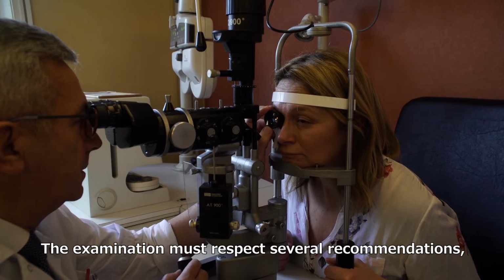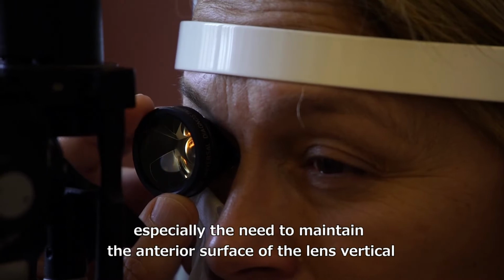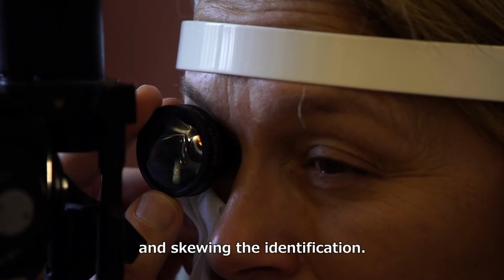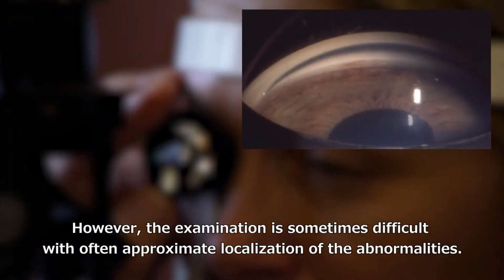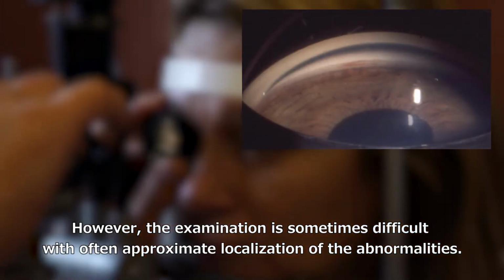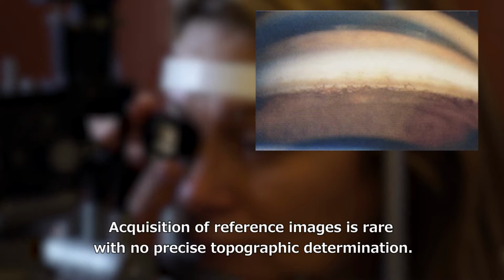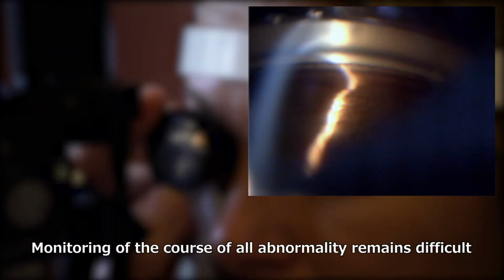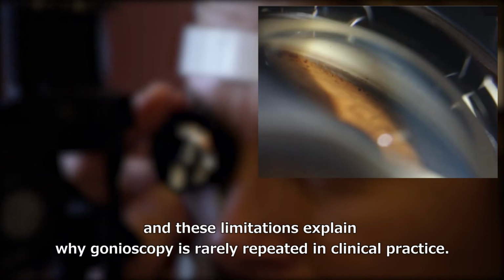The examination must respect several recommendations, especially the need to maintain the anterior surface of the lens vertical to avoid artificially modifying the anatomical relations and skewing their identification. However, the examination is sometimes difficult, with often an approximate localization of the abnormalities. Acquisition of a reference image is rare, with no precise topographic determination. Monitoring of the course of any abnormality remains difficult, and these limitations explain why gonioscopy is rarely repeated in clinical practice.